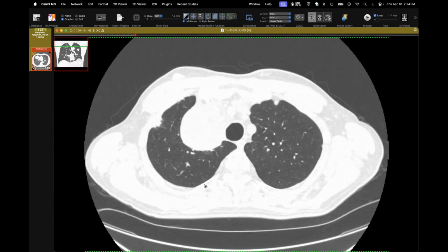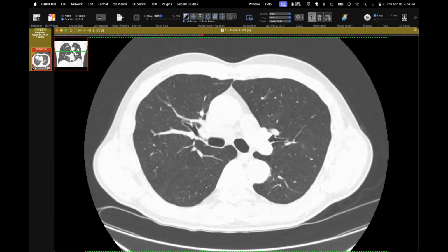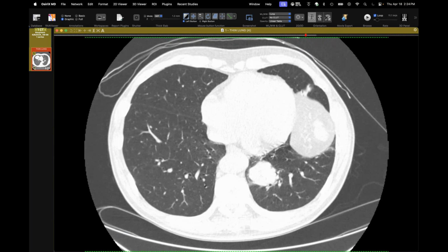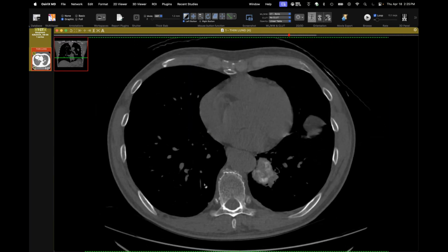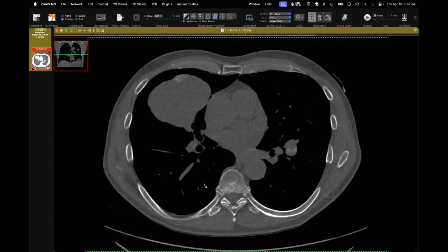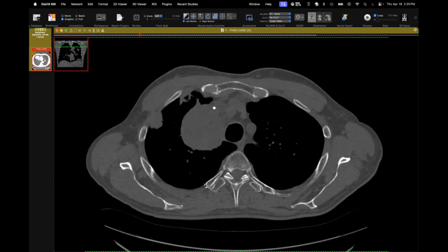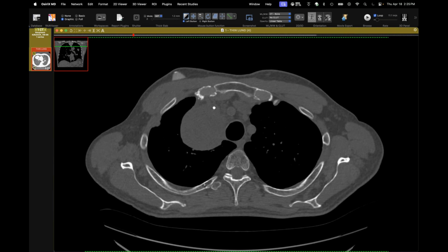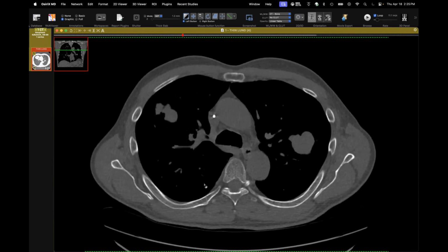Yes. Okay. So this patient has a cancer and has all these blobs in the lungs. The reason I'm showing this case is because of what these blobs look like, let me get the right window here. You can see they have some mineral or something in them. This is not a common tumor in adults, and it's not a common appearance of the metastases to see this, but any guess what this patient's primary cancer is?